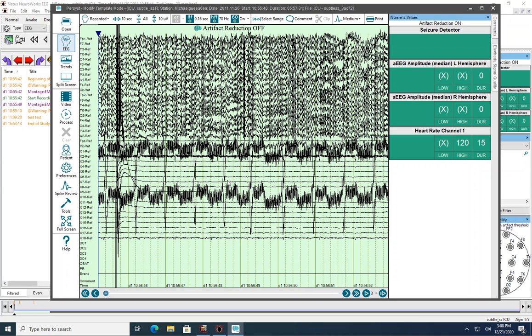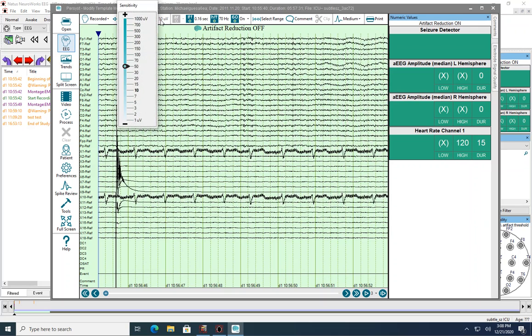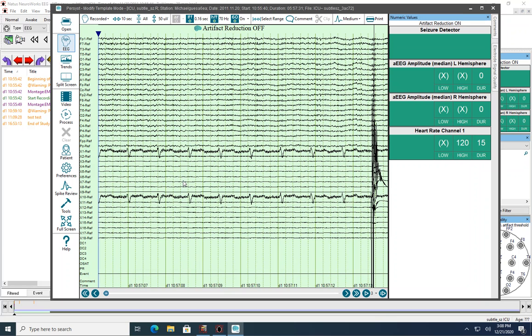If they're not harmonized, you'll need more than one trend settings file because you're using different labels. But that's a good reason then to go ahead and have those labels harmonized so they always use the same labels for the EKG inputs, regardless of where they're plugged in. So with all that aside, I'm going to go ahead and change the sensitivity here, make sure that it looks like I have X1 and X10 as the inputs. So we'll just use X1 to start.